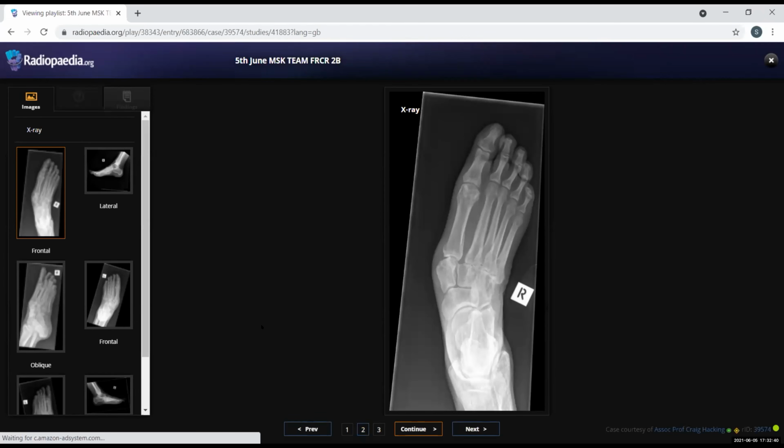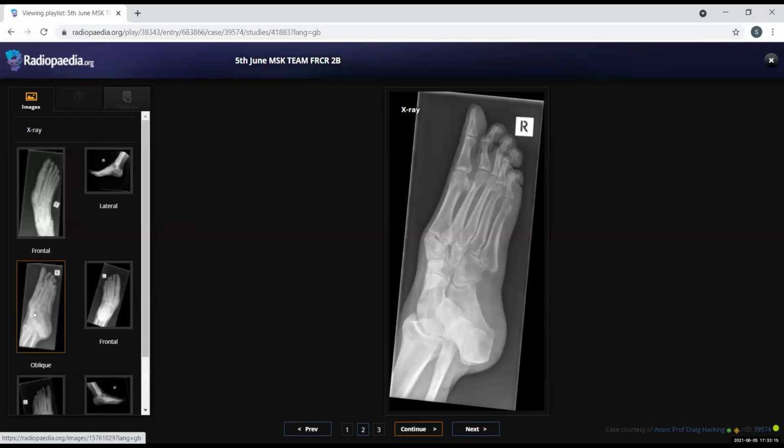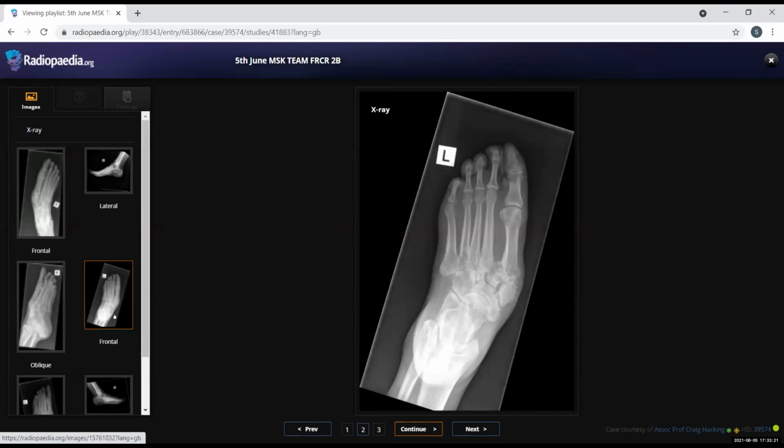See any X-rays you need. This is a review in the clinic. This is a radiograph of the right foot in a dorsoplantar view, and the patient seems to have long metatarsal bones. I wonder if he's having arachnodactyly. There is also a malalignment of the tarsometatarsal joints at the first and second, probably also the lateral metatarsals. If the patient has a history of trauma, then I would be doubtful, but it's on the left side as well.